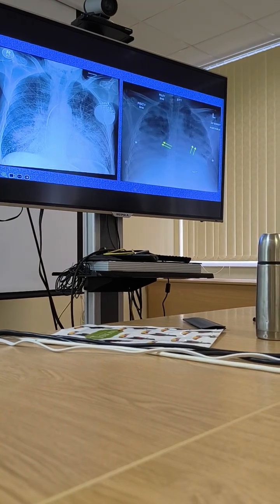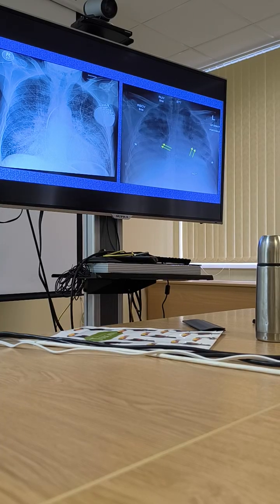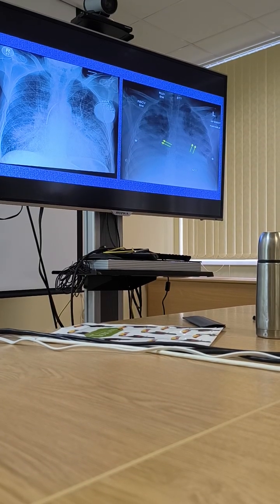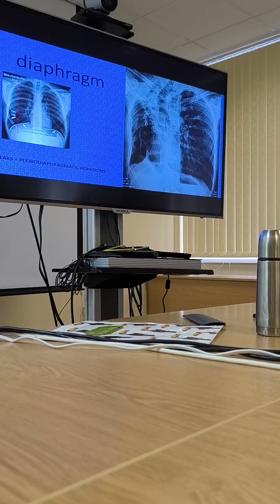So in this patient, we see at the same time both cardiac failure and signs of respiratory distress syndrome, and usually they go side by side. But in a typical situation we see it like this.